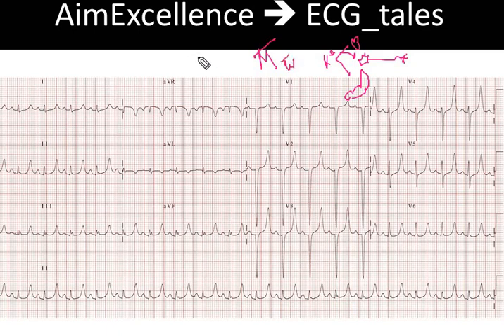When the potassium level goes up, what actually catches the attention of a physician is dyspnea and palpitation. Then the patient comes, we do the ECG, and then we see this particular sort of finding, and this is actually a moderate finding.